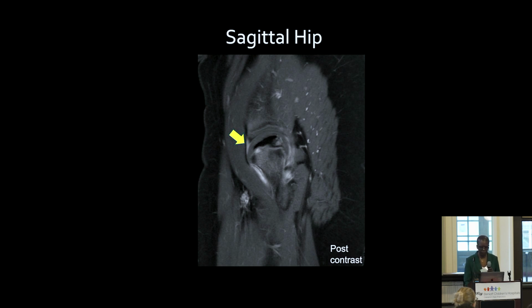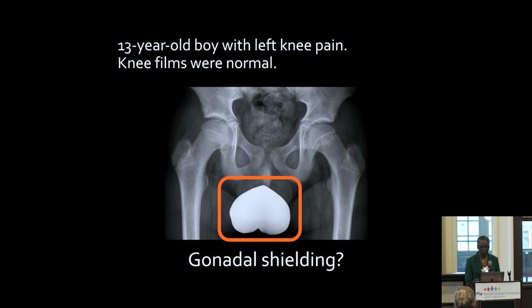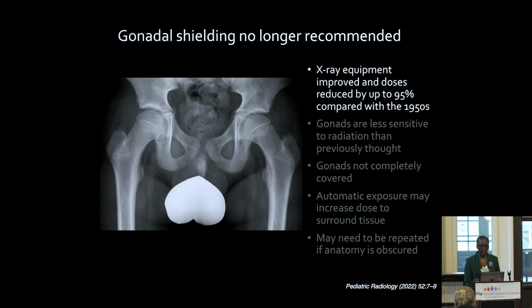So now here's a 13-year-old boy with left knee pain, and the knee films were normal. We'll get to the pathology, but some of you have probably noticed and are wondering, what is that gonadal shielding all about? Gonadal shielding is actually no longer recommended by the Society for Pediatric Radiology and the American College of Radiology, and there are several reasons for that.